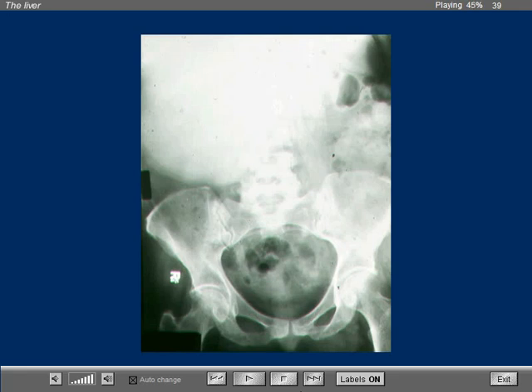In this patient, who did not have high blood pressure and presented with vague abdominal pain, there was a palpable right upper quadrant mass. Also, a calcification was seen in the left upper quadrant. As we shall see later, the calcification was rounded and it was misinterpreted as a splenic artery aneurysm. We could not see adequately the outline of the kidneys in this scout film of the abdomen.